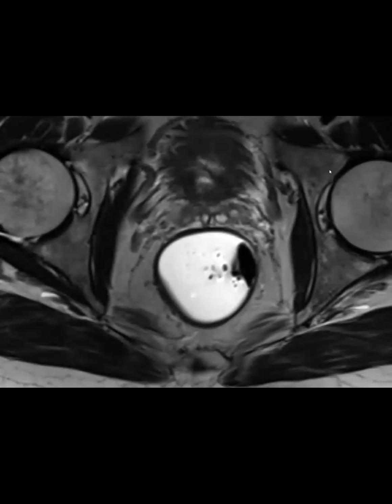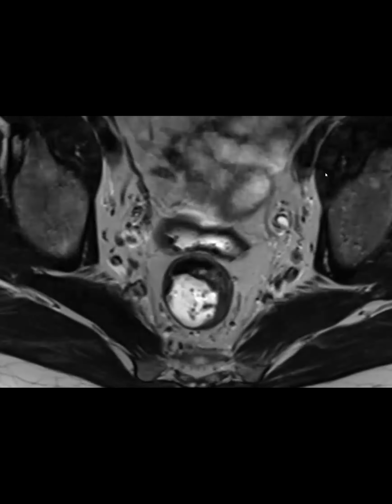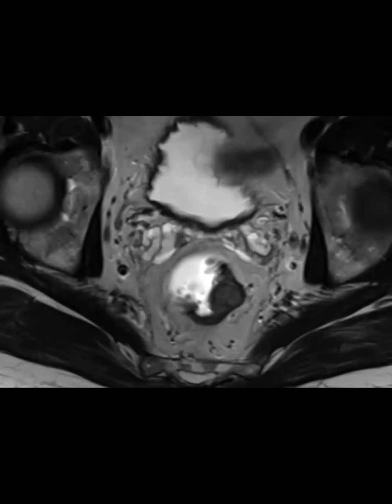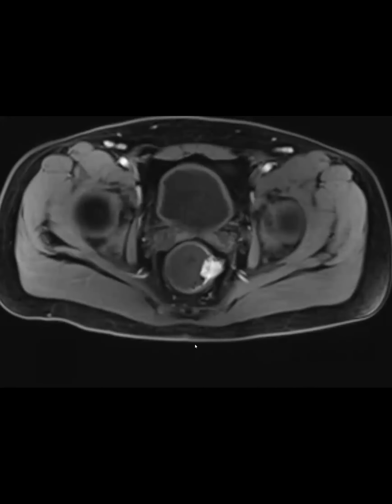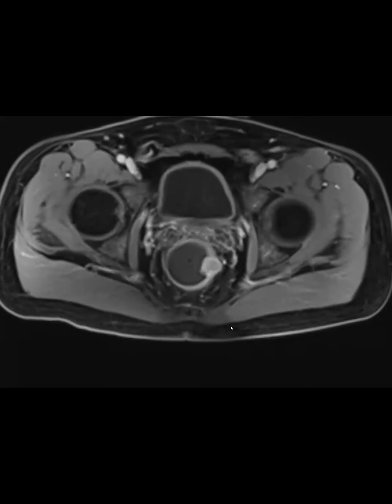Okay, so this was a rectal protocol case. Stop on the area of the finding. So there's this T2 intermediate signal mass here. And then I'm going to show you the post-contrast. There it is on post-con, and it's measuring a little over 2 centimeters, which is kind of important. In a few minutes, I'll tell you why. That's the arterial phase, and then this is the more delayed phase.